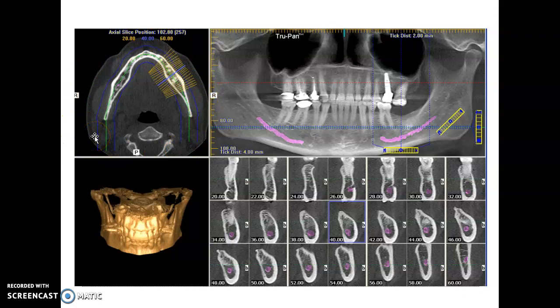Okay? So if you were to take this whole image and just cut out a little piece, flip it so that you could look at the underside, this is the view that you would have. And then you have more lines coming down here vertically that kind of cut in a little bit. And you have all these little scale things going on here. This is the one that I want to particularly point out.